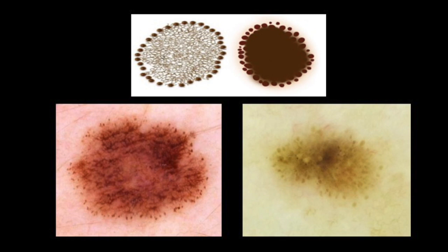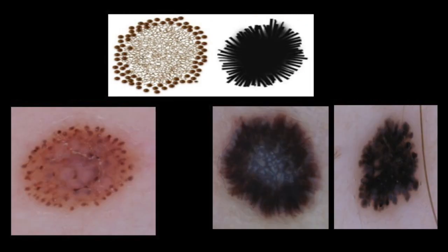0.7 millimeter melanoma, Clark's nevus. Okay? So peripheral globules are benign, but only if there's network in the middle. That's the reason for showing that. And here's some more of these tiered globules. The one all the way on the left is the classic example of a tiered globular nevus. Again, spitzoid morphology. And then your Reed's nevus with streaks, and your Reed's nevus with pseudopods, but all of them are within the grouping of Starburst pattern.